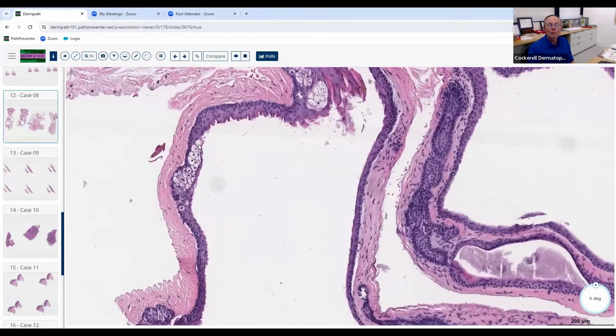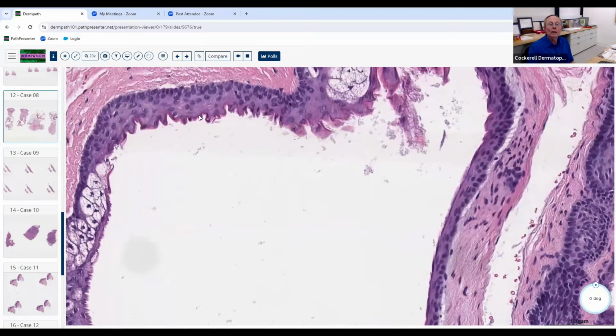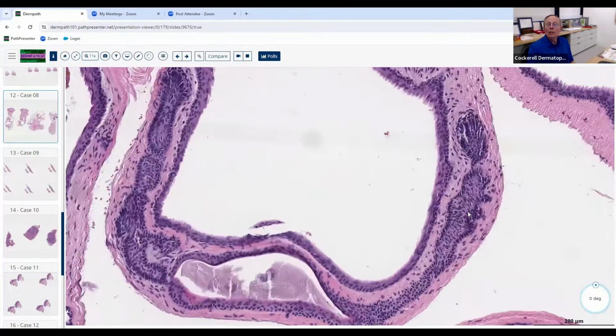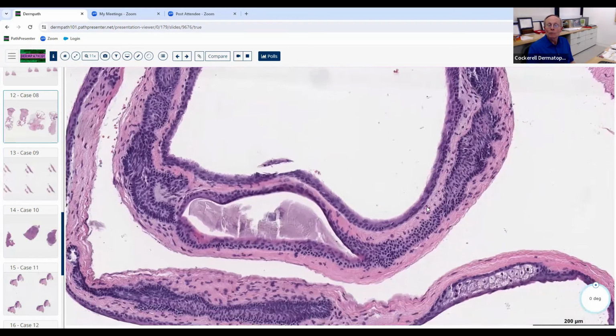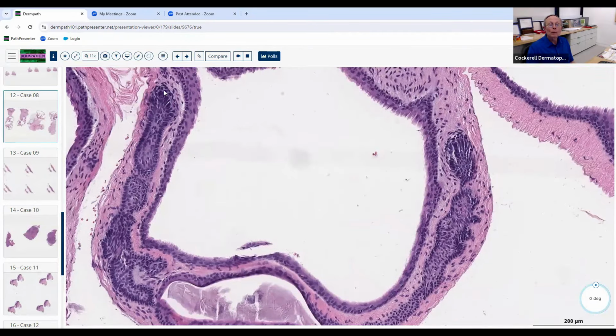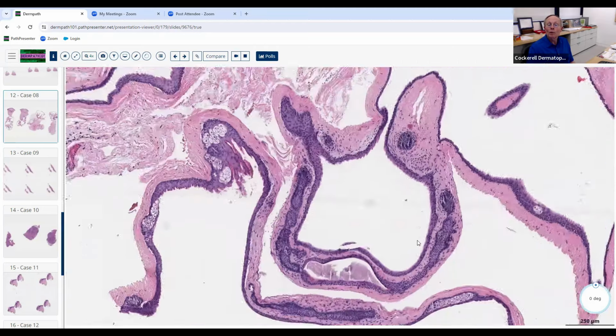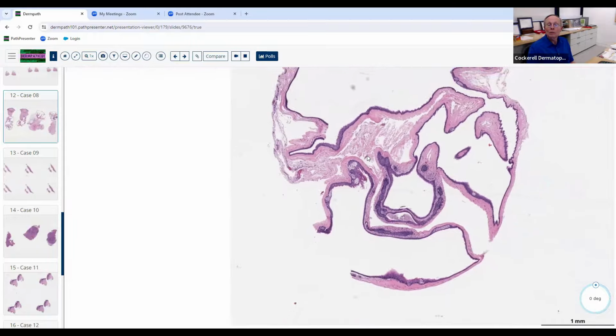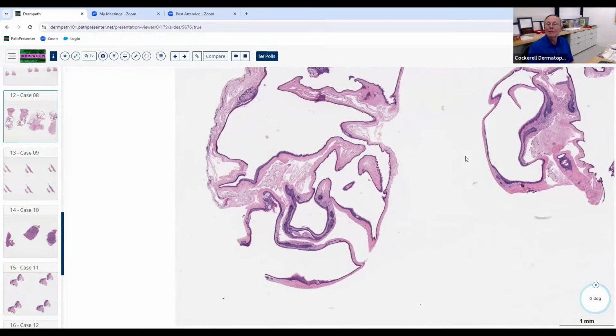You'd have some sebaceous cells in the wall, then you have a little corrugated lining. This does have a little bit of a cornified layer to it, and it's got this morphology that you see here. Here's a little residual mantle zone, interesting here. So this is where you've got some of these residual little hair follicle primordial structures in the mantle zone that formed here, in addition to the steatocystoma. So this is an interesting little site, this little mantle zone area.